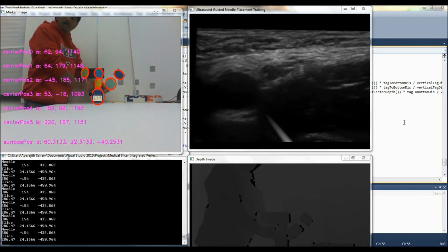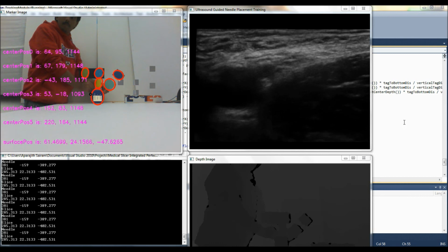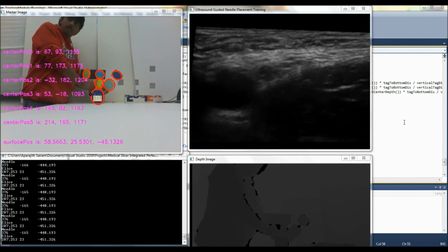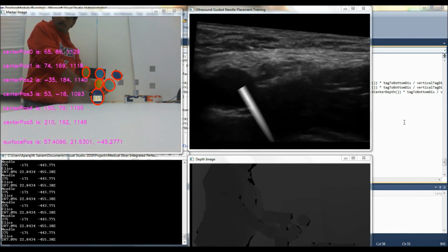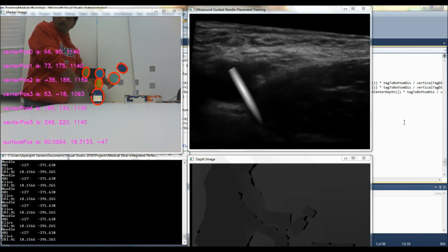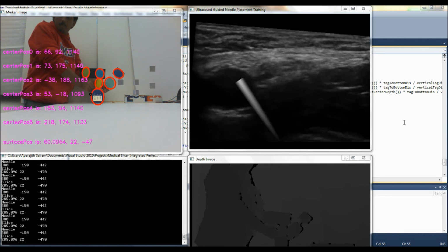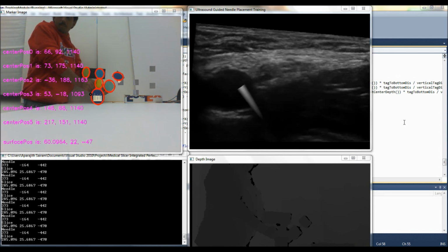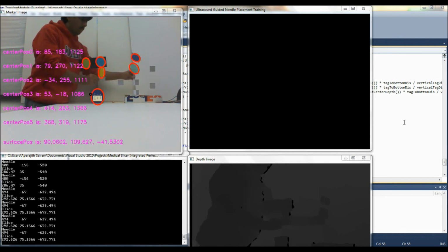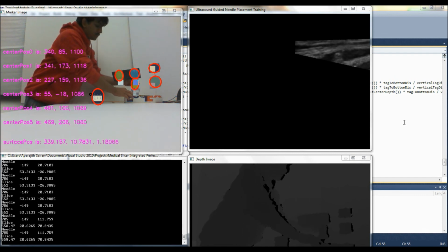The bright grey line which can now be seen is actually a visualization of the needle. As you can see, the needle sometimes appears in the image and is not visible at other times. This is because slight changes in the position of the hand removes the needle from the slice plane and thus it cannot be shown in the image. This actually simulates the real ultrasound device, which is also very sensitive. Right now, needle visualization is not that much refined, but with little more time, I am very sure that the quality of the software can be drastically improved in terms of needle visualization.